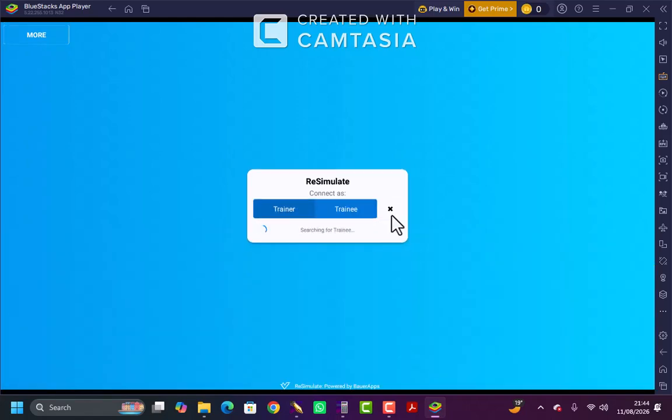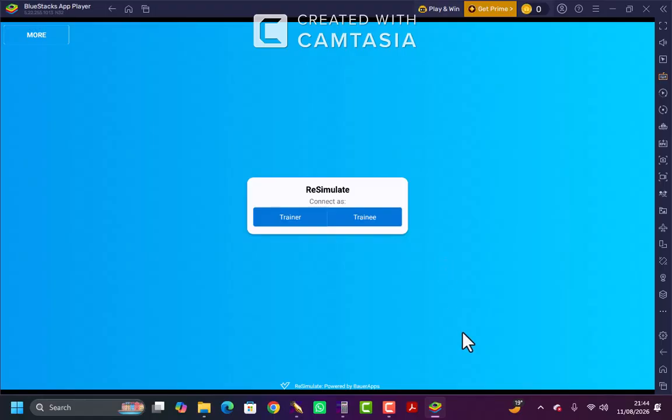I do not have one, so for the rest of the video I'll be showing you the app and what it does, and not trying to find a device for the app to run, which I did when I first tried the app. But now I'll run solo mode.